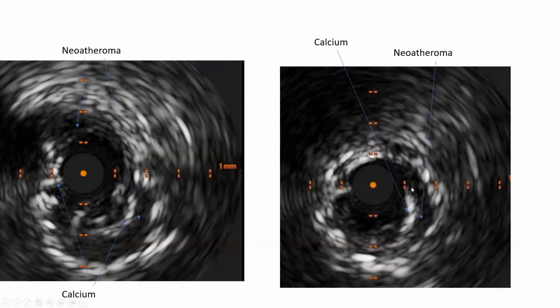Again, here one may think this is not calcified neoatheroma. This is an underexpanded inner stent layer. Like this is one stent, this is the other stent. But it's more like a calcified neoatheroma. The run helps you say that. Also, the fact that you see two stent layers well expanded, and the run helps you define that this is neoatheroma and this is calcium inside that neoatheroma.